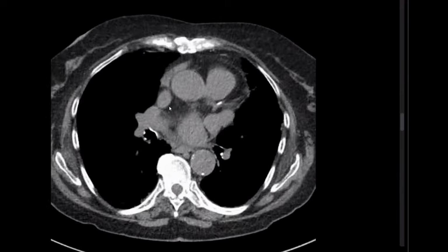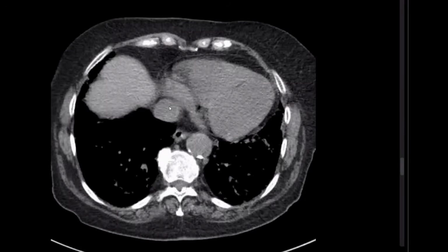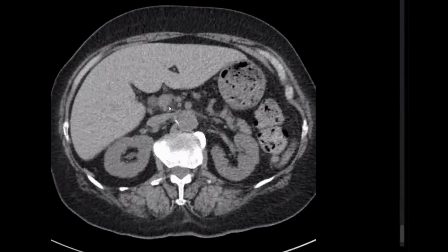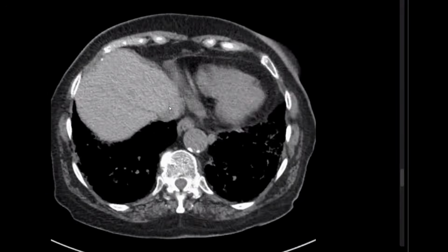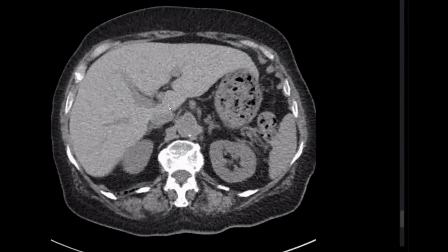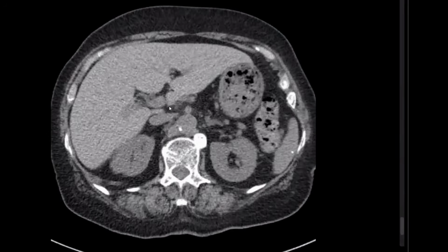Can you search for the cause, please? We enumerated how to search for the cause. We have either UIP pattern or NSIP pattern, but I think it is toward UIP pattern. How can you help me to search for the cause? There are multiple causes for usual interstitial pneumonia pattern, such as asbestos-related pleural disease. We don't have any pleural calcified plaques. We don't have any dilated esophagus, and the other thing is hyperdense liver, which I can appreciate.